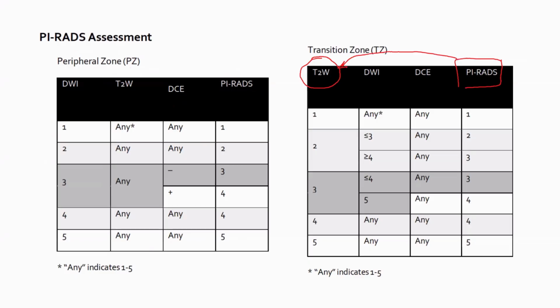If we have any lesion in the transitional zone, we will give it a score from 1 to 5. To be clear from now, scores 1 and 2 are most likely nodules. Score 3 looks like smearing or charcoal in shape.